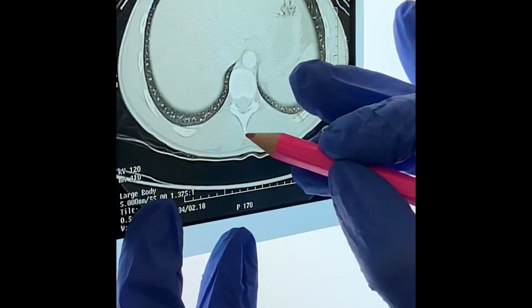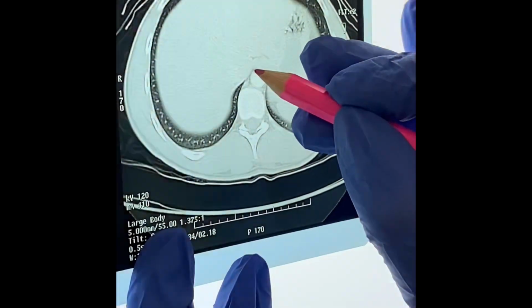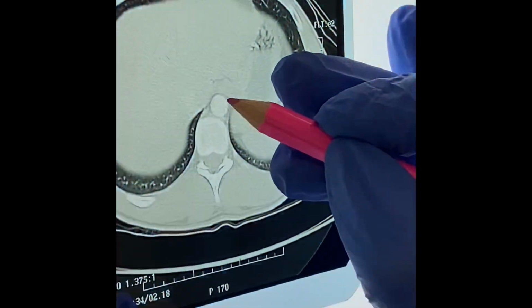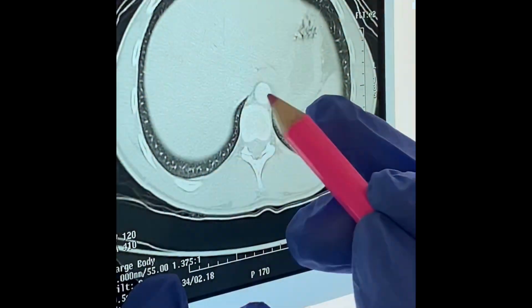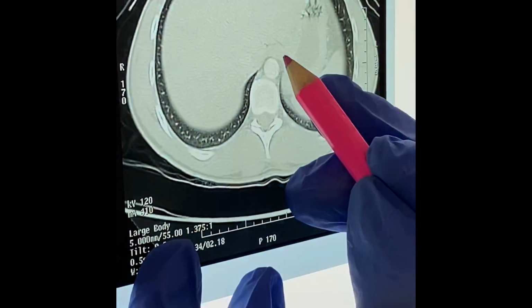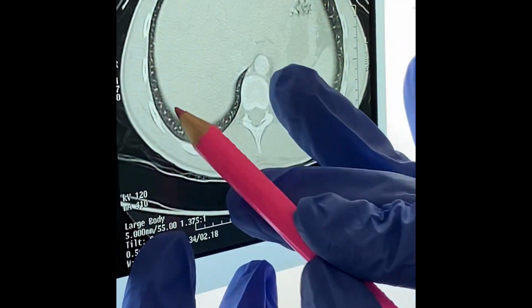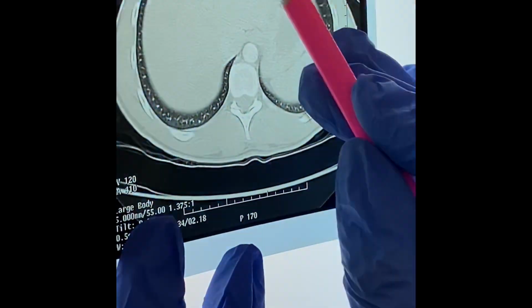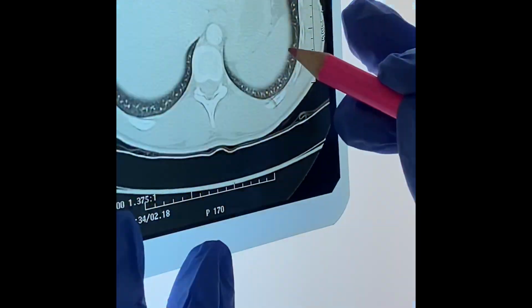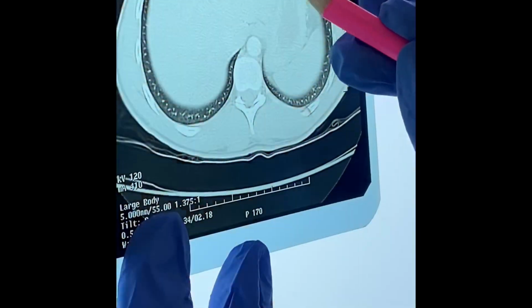Now let's try to identify structures in this section here. You have identified the vertebrae. In front of the vertebrae here, this rounded structure, this is your descending thoracic aorta. So this is the level at which the descending thoracic aorta will pierce the diaphragm. This is at T12 level. Now this gray impression here, this marking, full marking, is of the diaphragm, but you can appreciate here, this is the spleen, and in front of it, this small area here, this is a part of the stomach.